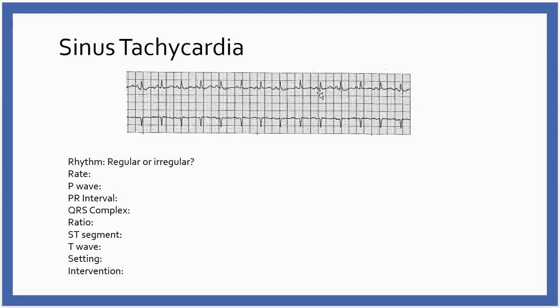Okay, you do that too. Mark it on your paper, beginning of the QRS to the end of the T wave. The nice thing about marking it on the paper is that you can then take that paper down to where you can look and see the baby boxes a little bit easier. So I'm 1 baby box short of 2 big boxes, if that makes sense. If the duration for the QT interval had been 2 big boxes, that would have been 0.40, but I'm 1 baby box short. So my QT interval is 0.36, which is within my normal range right now. Now remember, this is tachycardia, but still we're just going to say it's within normal range.